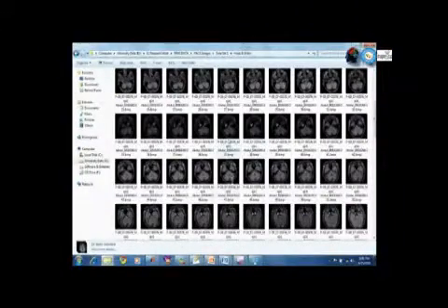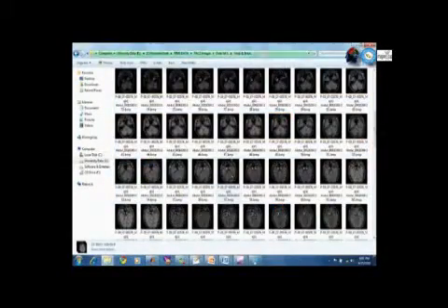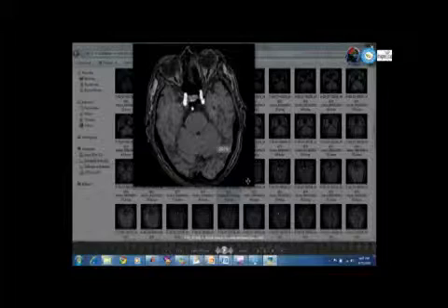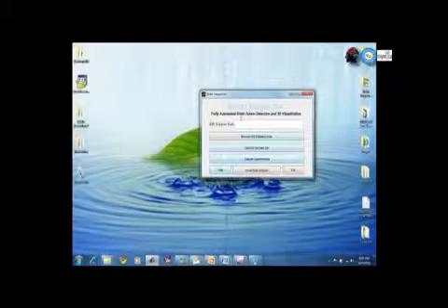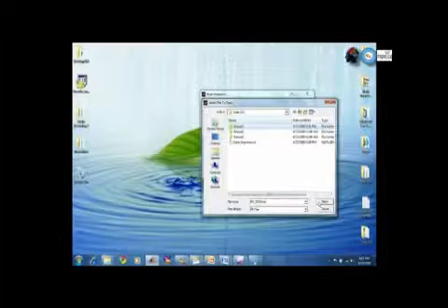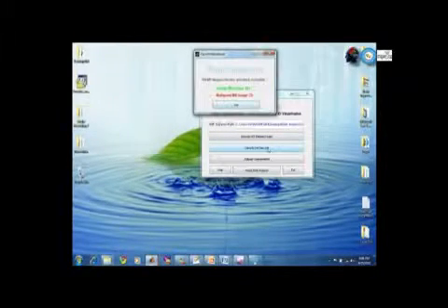These are 168 brain MRI scans of a patient having a tumor in his brain. You can see here from these MR images, mostly do not contain tumors, but few of these have a tumor in them. Now run the application. Here, first of all, we select the dataset path. Now we classify these images into normal and abnormal category. The results will be saved in two different folders, having normal and abnormal images. Classification of MRI scan is successfully completed.